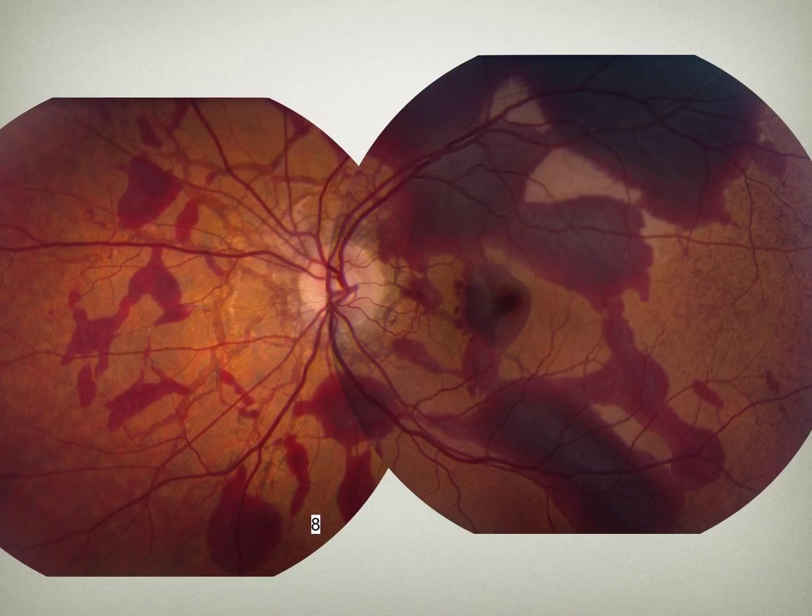They came in, this is obviously the fellow eye, and that eye got hit. I don't even remember what the name of the kind of blood trauma was. Unless it's your eye, right? But that brings up another good point. If you see a little hemorrhage, you don't always know if it's a CNV or if it's just a little bit of trauma or just some spontaneous crack. So what kind of study do you want to get to differentiate how you're going to treat them and manage them? Right, you want to get a fluorescein, because then if it's a CNV, you're going to see this leakage, this hyperfluorescence that expands and goes beyond its original borders. Thanks, Aaron. And actually up here, it's kind of whitish. That's probably either commotio or old blood, and I don't know which.